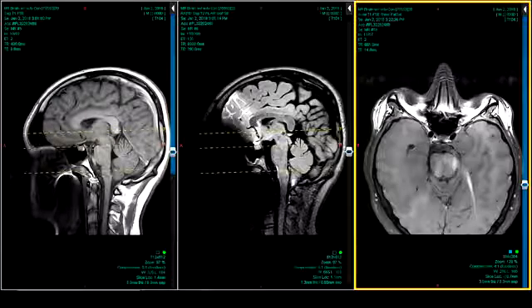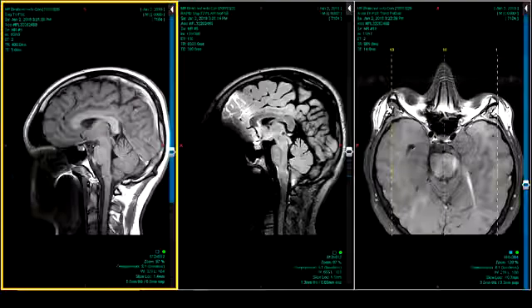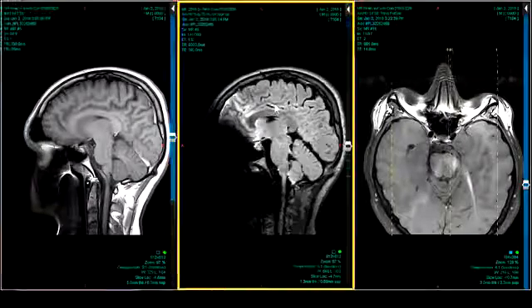So 18-year-old looks like they have invested some money in braces for their child.